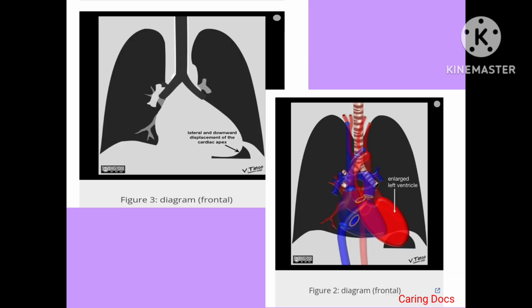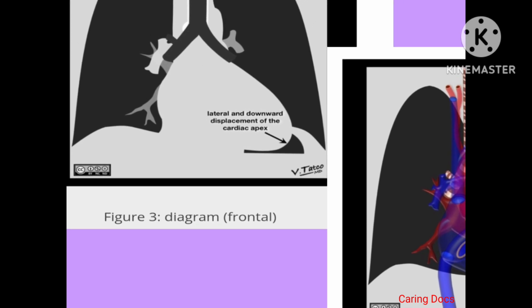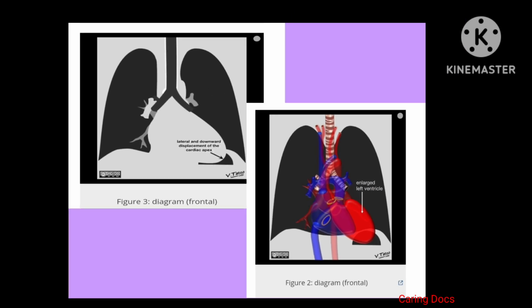This is the chest X-ray suggestive of lateral and downward displacement of the cardiac apex.